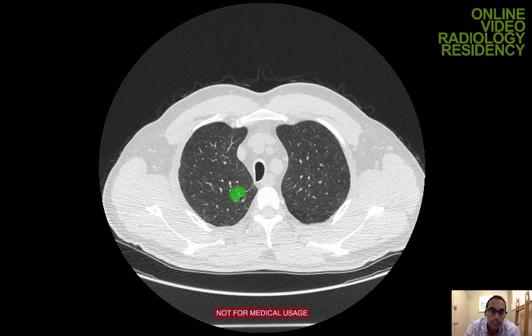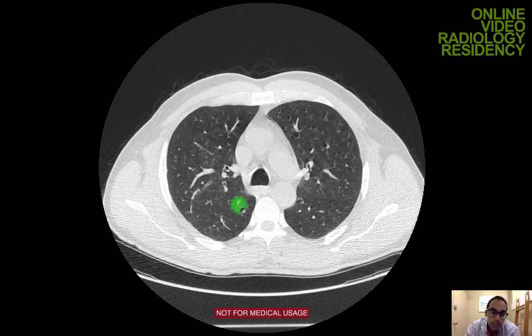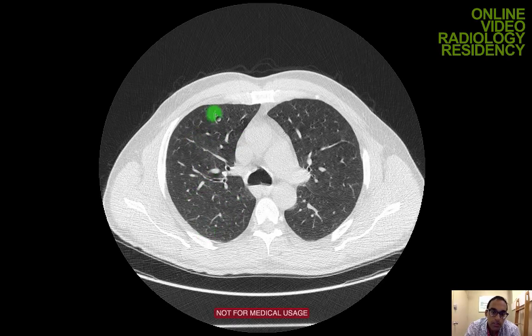So here again, I'm on thin sections, lung windows of the axial imaging set. Looking at the lung parenchyma, confirming the normal anatomy here, it should be an air-filled structure. It should be dark on CT. There are all these branching structures within, which are the vessels. There are pulmonary arteries and pulmonary veins coursing through, and there should be nice tapering out to the periphery.